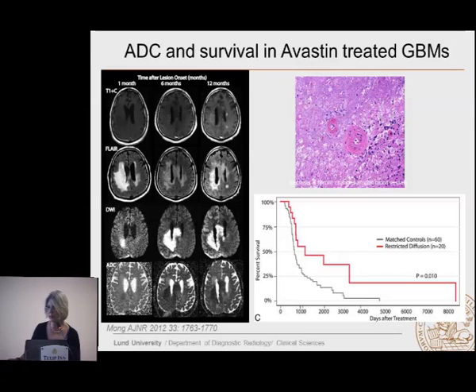But what's interesting is that in the diffusion-weighted images, you could see there's a significant increase in diffusion in the B1000 value, and a reduction in the ADC value that are fairly stable over time. And when he did this study, he could see that those patients that had these diffusion-weighted and ADC abnormalities actually had a longer survival compared to those that did not demonstrate any diffusion abnormalities. So it seems that somehow these are stable and somehow indicate a stable condition for the patient, and it's not worsening of the disease as one might believe when we think about diffusion. And restricted diffusion usually should be a high cellular density tumor. So in this case, when you treat with Avastin, that you see diffusion abnormalities and you see a decrease in the ADC, might be a positive prognostic value for that individual.